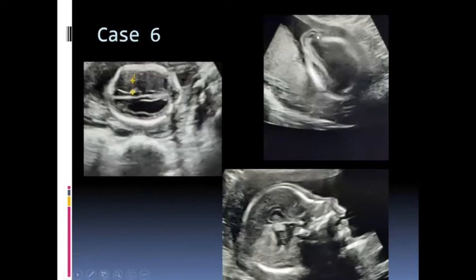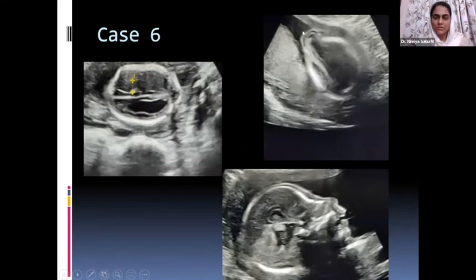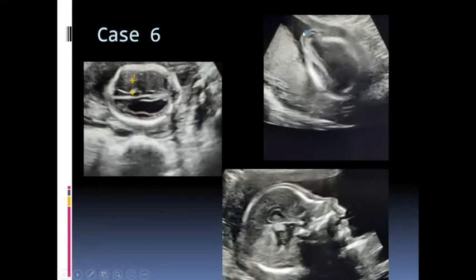I'll just help you. What is happening here? Herniation. Yeah. The skull is appearing abnormal, and there is some herniation happening here. There is an encephalocele happening. Okay. Because of that, the brain is pulled out, and there is some hydrocephalus. And also there is a flat face. So some syndrome with encephalocele, because encephalocele can be a Chiari 3 malformation. Okay.